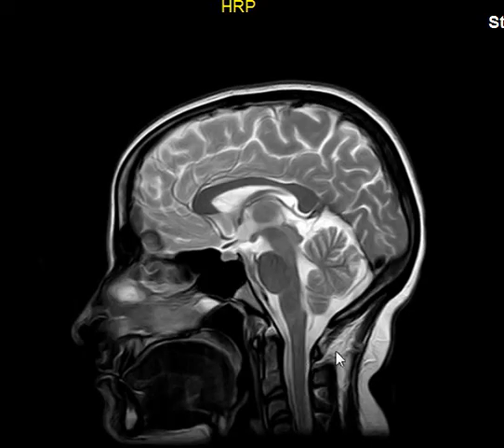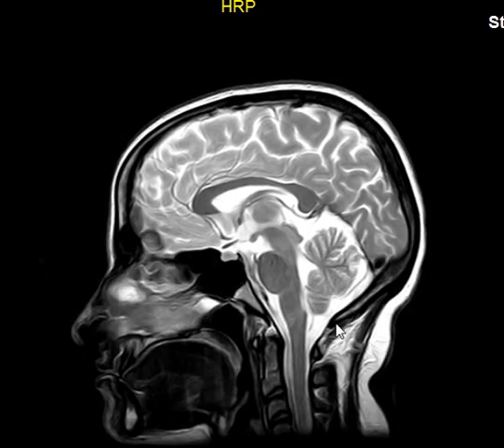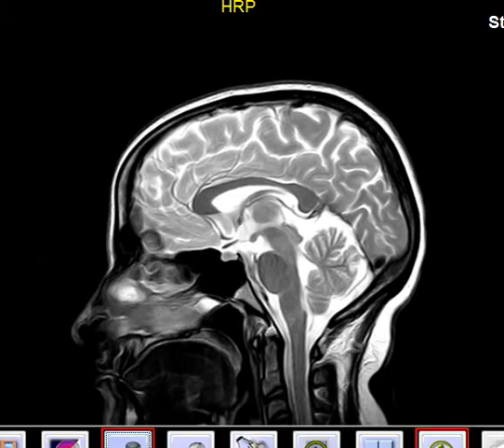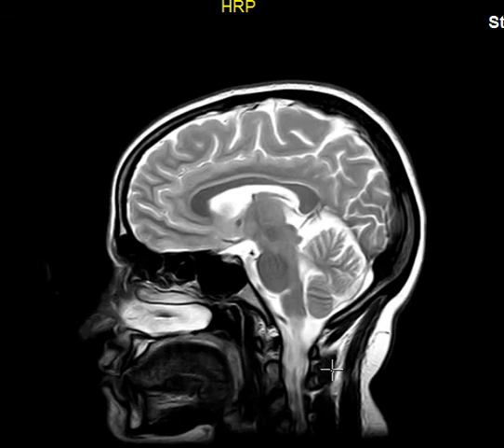And now what we have here, we have the foramen magnum. You can see this is the table of the bone, and this is the bone. Between them, between the clivus and the occipital bone is this. I try to show you this from here to here. This is the foramen magnum, where everything goes out and in from here.